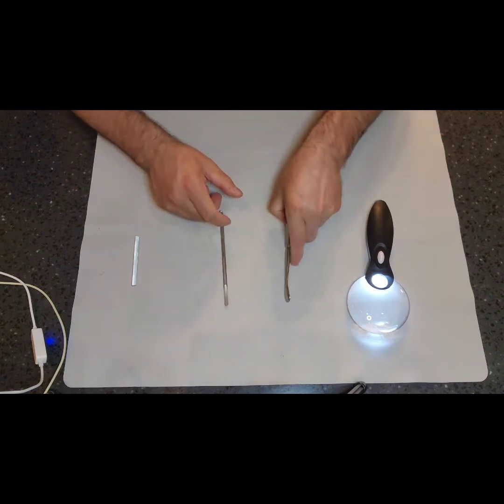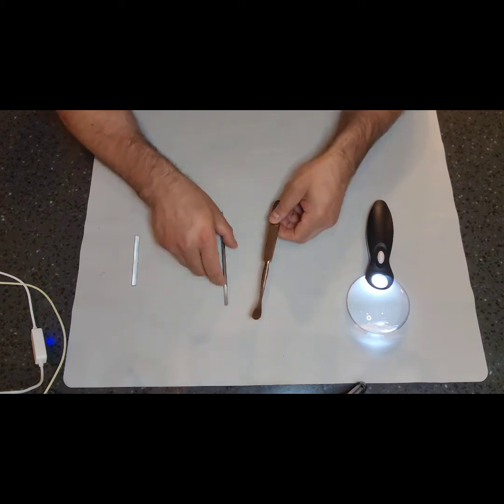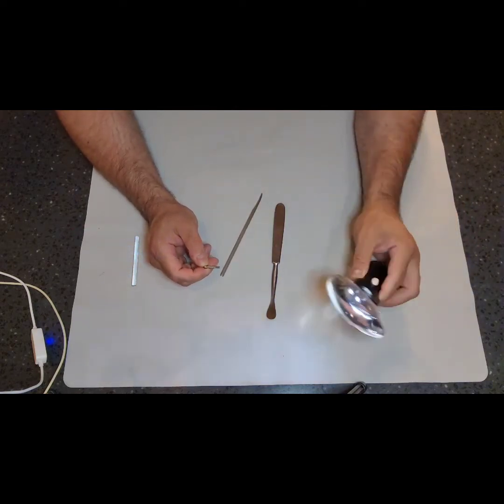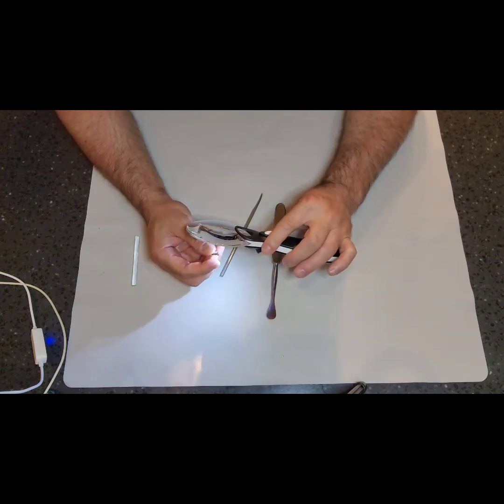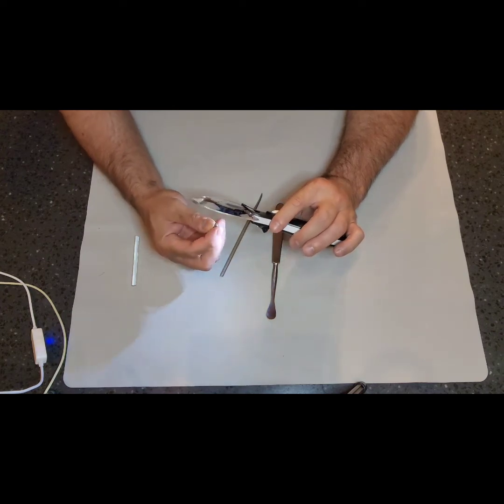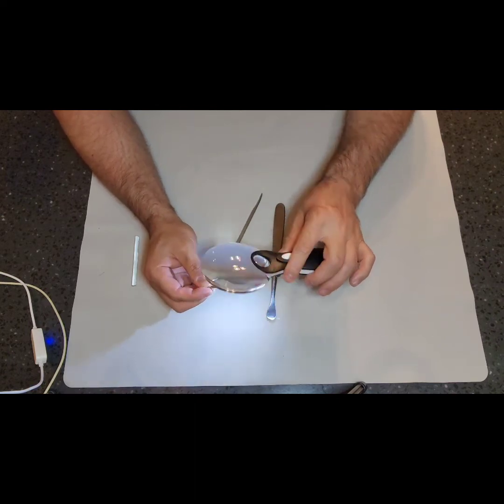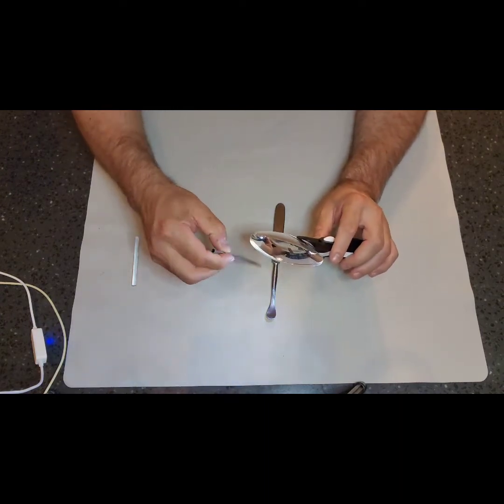But what are we inspecting? We're looking for pitting. We're looking for any soils. If it has any removable parts, we want to remove them and inspect them well. So here comes our handy dandy lighted magnification, and we're looking for any soils. This happens to have a spring action or blade holding jaw that moves, so you're looking for any cracks, any debris right in that gap. The threads. There is a hollow area here.